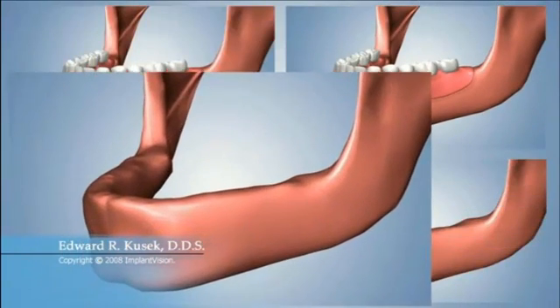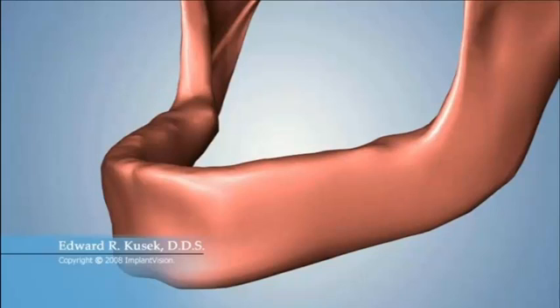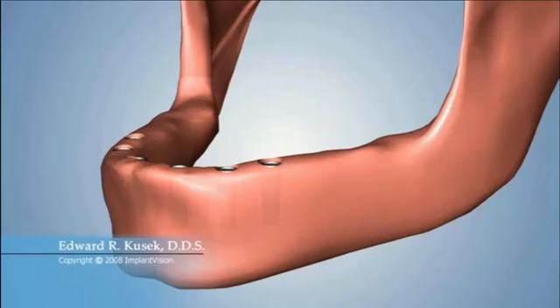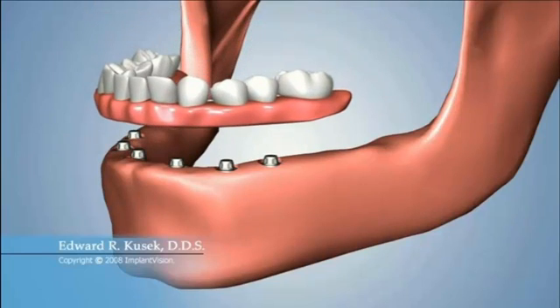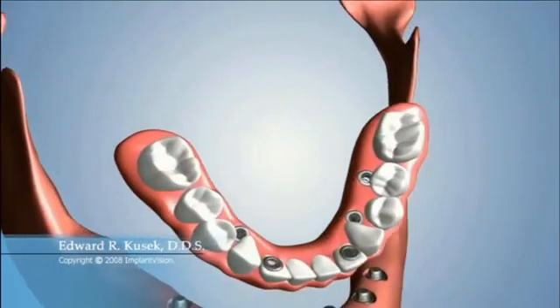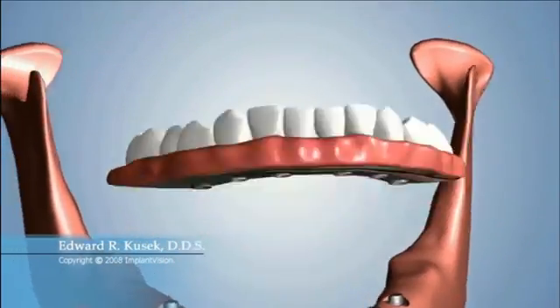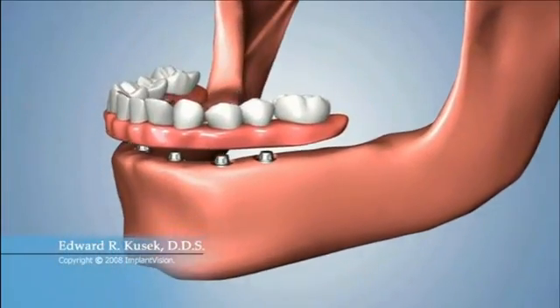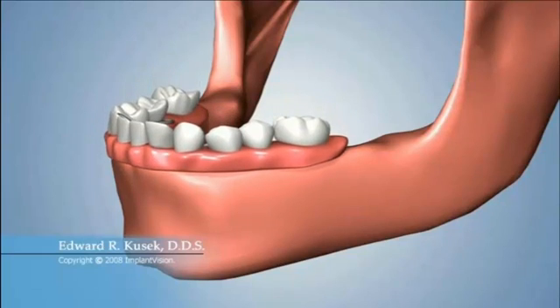A third option involves the placement of 5 or 6 dental implants. Specialized attachments cover the implants to facilitate the placement of what is known as a fixed detachable denture. The denture is designed with small holes that allow specialized screws to pass through and connect it directly to the implants. This is a very stable and secure treatment option that can only be removed or detached by a dental professional.